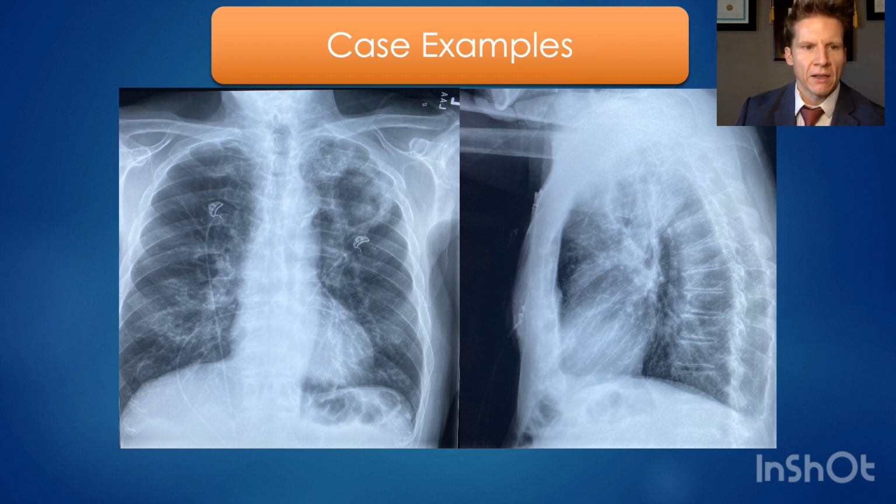So again, going back to our discussion of abnormal things that are too dark in the lung, being either pneumomediastinum, a pneumothorax, or something in the lung, you always have to think, is it coming from inside of the lung related to rupture or perforation of an internal structure? Like, did the lung collapse?